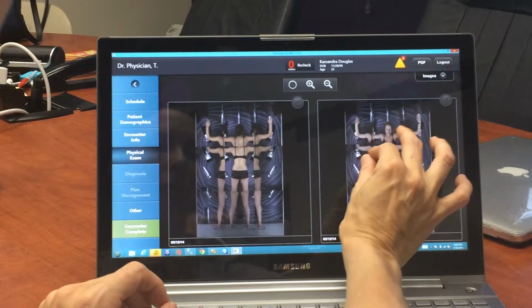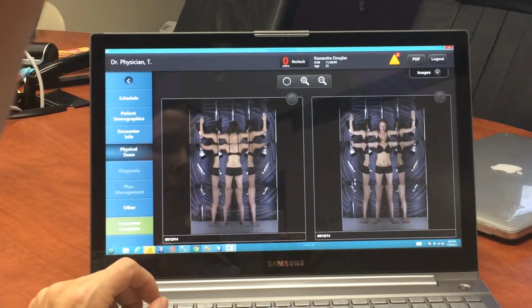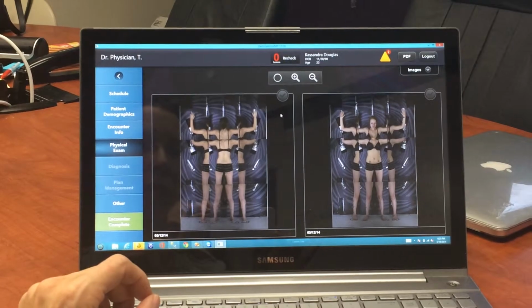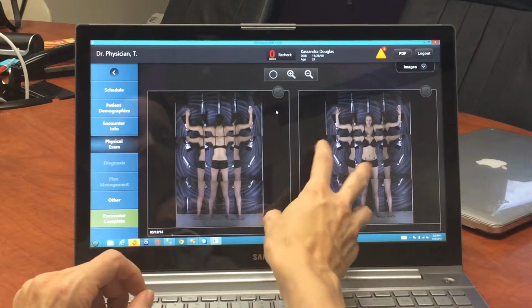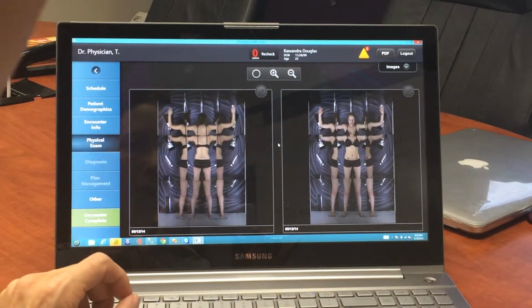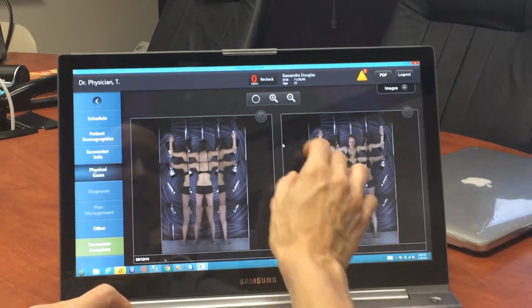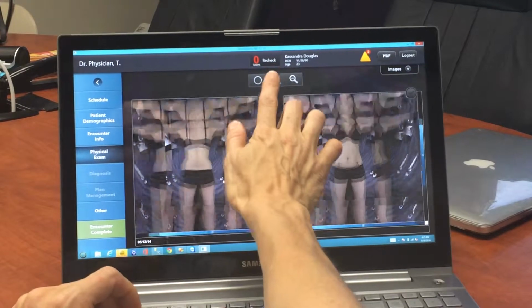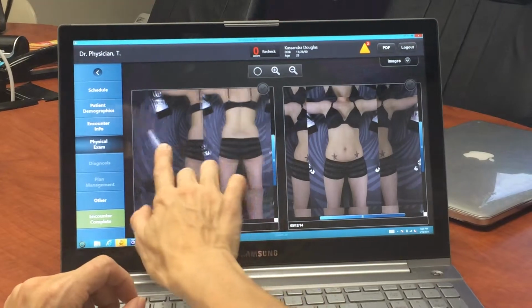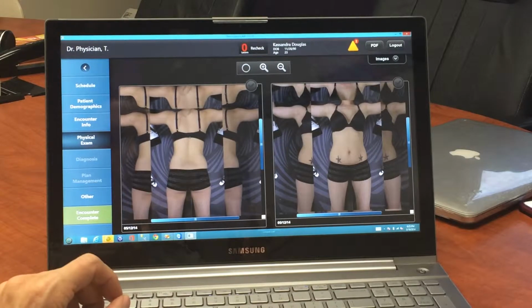The other element that I wanted to describe to you is the fact that when you see the images, they're in what we call a 3x3 configuration, which is 9 images just basically put side by side. The next version of Dern Spectra will actually have the images completely stitched, so will be just one image of the individual. But this is again part of the development effort and the reason why we're doing beta testing at this point. So again, the other element you need to remember is that when you are zooming in, if you want to move the image, you will be moving the image just individually. They are not synchronized for panning at this point in time.